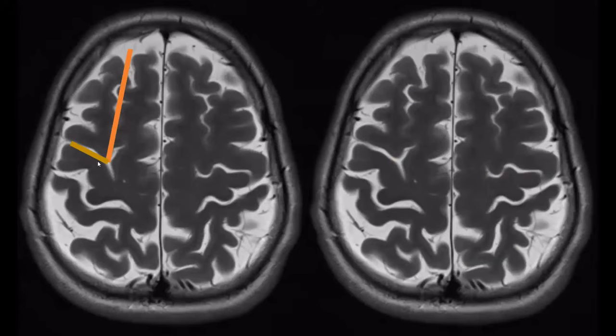This is another example. I've already drawn the letter L, and I'm probably going to teach you another trick. There are a lot of tricks to identify the precentral gyrus or the central sulcus. I am just going to show you the ones I use the most and I believe are the most convenient, because some of those are more academical and not very practical. So this is the letter L. So then we know that this must be the central sulcus, this must be the precentral gyrus.